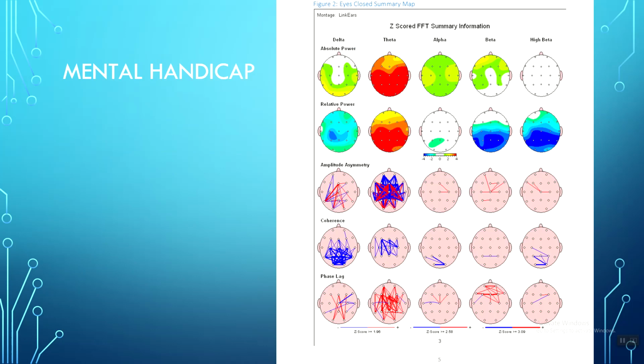And so what's happening is that his processing rhythm, which is called the alpha peak, is actually slowing down into the range of theta. Alpha is naturally 9 to 12 hertz, but it can slow down. And so in this individual's case, we're seeing a person that's operating at the speed of a child, even though he's a man.